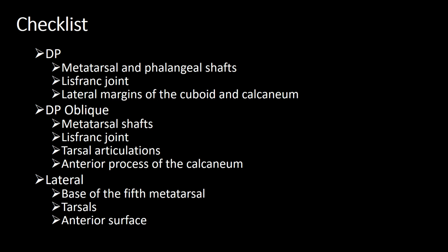On your DP oblique view, again, check your metatarsal shafts. Always look at your Lisfranc joint. Check the tarsal articulations and also check the anterior process of the calcaneum. It's on the DP oblique view that this is frequently the only view that you can see this injury.